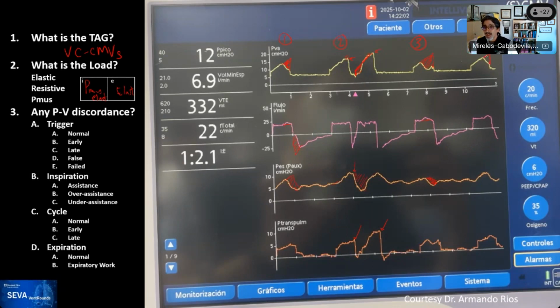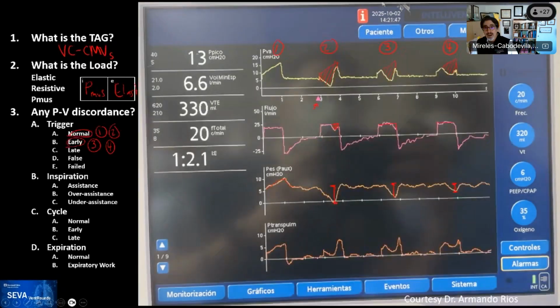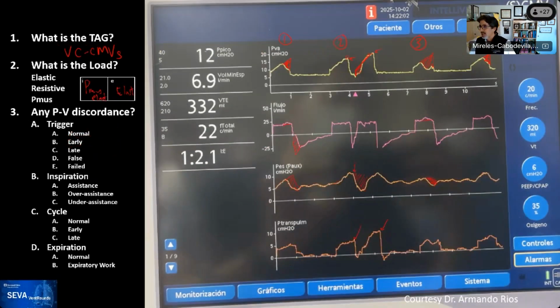So you see here in this strip of 4 breaths, different timings at which the early trigger can occur. Later on the inspiration, immediately after expiration, middle of the breath, and again at the end of the breath. And in the prior one, you can see it even earlier than that. So this just talks about these different phenotypes that are being published about early trigger.